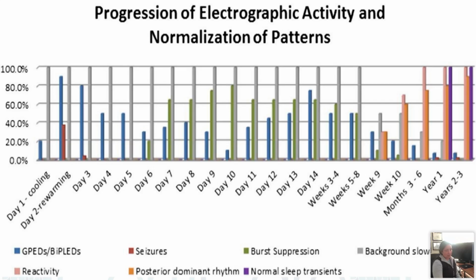Doesn't mean the patient wasn't sleeping. They were sleeping. Having sleep architecture is a sign of good prognosis. Even in the ICU, whenever you hook up a patient who's comatose, if you still see rudimentary spindles, that's a good sign. That's a good prognosis, actually. So it took the patient 1 year to show some sleep architecture. So this is one of the good stories.